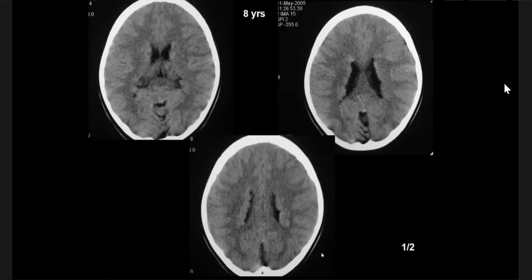Hello, hi. Okay. So this is congenital. I am going to show you about, I think, 6-7 cases from congenital, and I want to crack on very fast. These are the cases which have come in the exam, and then we will go for trauma. You will like trauma because all of you know trauma. So we'll go very high speed.